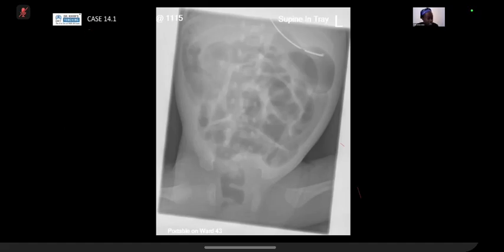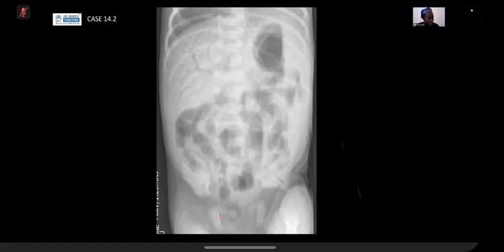So speaking of typical findings and things that demonstrate NEC, we can see here, as candidate 3 described, you have linear branching lucencies over the liver shadow, and they reach to the capsule of the liver, all the way out to the periphery, and this is in keeping with portal venous gas.